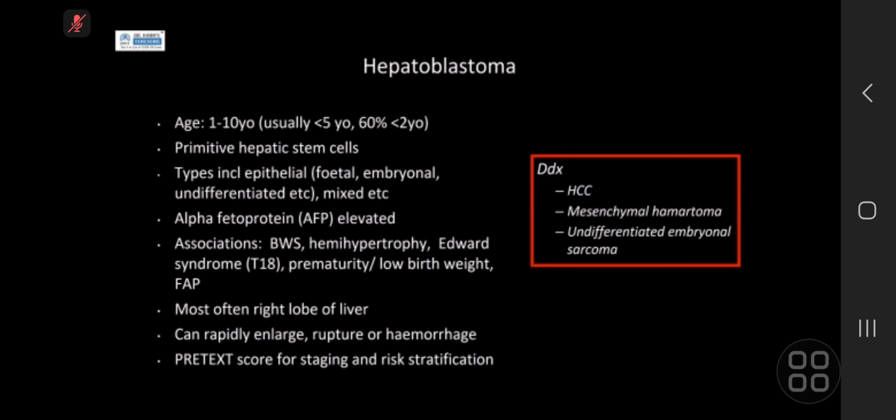Things to think of. Another thing that could look like this would be, I know I wrote undifferentiated embryonal sarcoma, but a true case was when we thought one was hepatoblastoma. It was sent away and they thought it was a hemangioma. It's because hemangiomas can also look quite aggressive, but often when you do phased imaging with contrast, you can see peripheral enhancement with central areas of persistent non-enhancement, and sometimes you can also get heart failure with shunting. Okay, so that's something to think about as well.